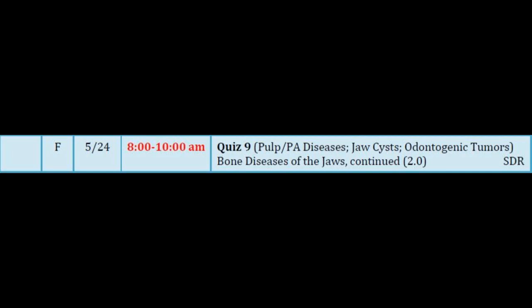Do you see a lesion here with the initial presentation? Does it look like the pulp and periapical things that we studied? No. Do we see a well-defined periapical lucency? No. So I'm not sure what the dentist was thinking, and there's kind of some vague bony changes. So that one ended up being metastatic breast, but I want you to notice something in this one.